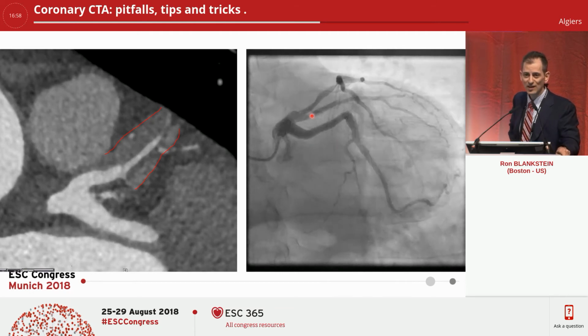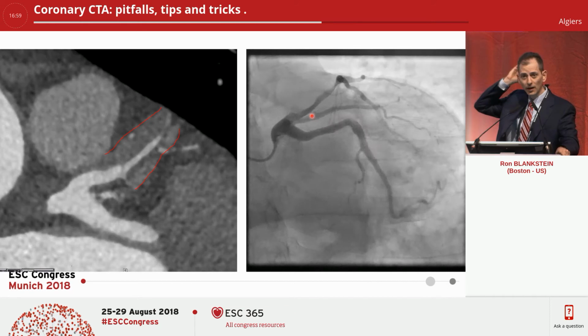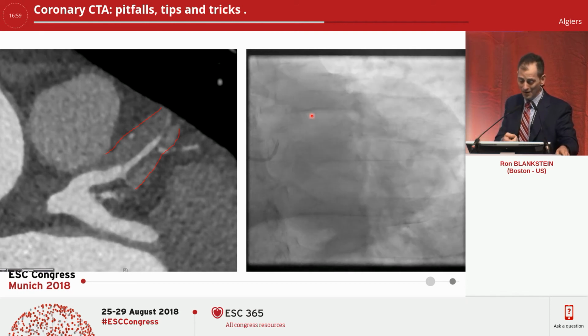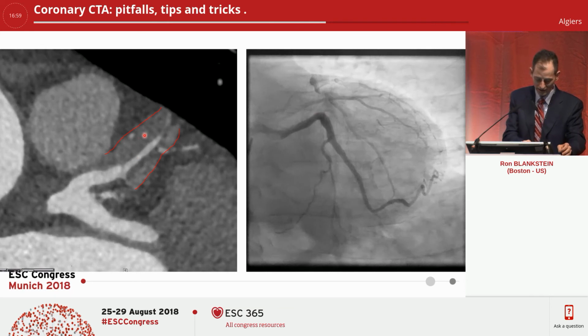But when you have this amount of thrombosis around a vessel, you have to be very careful and know that this is a high-risk intervention. And I have to tell you that my fellows in the cath lab said, well, we often don't know this, because if we didn't have the CT beforehand, there's no way we would know that there's all this clot all the way around.